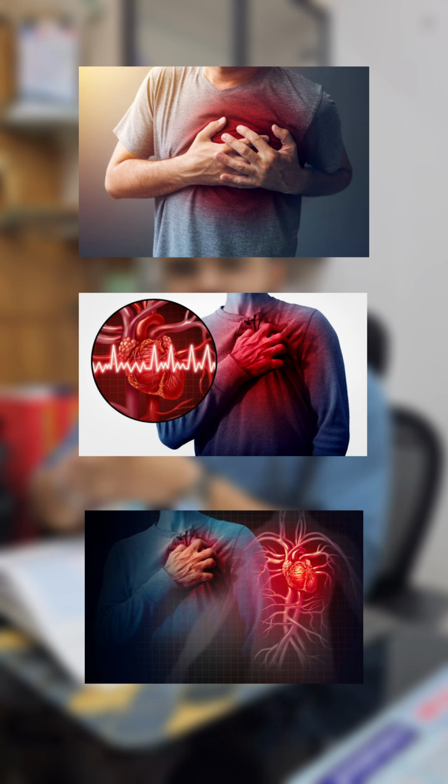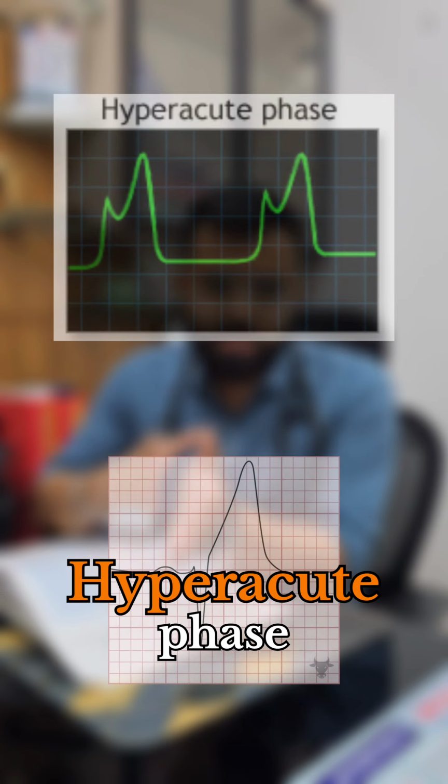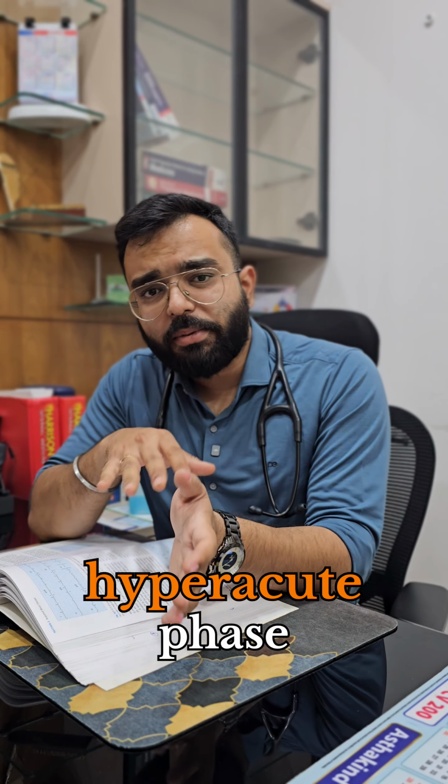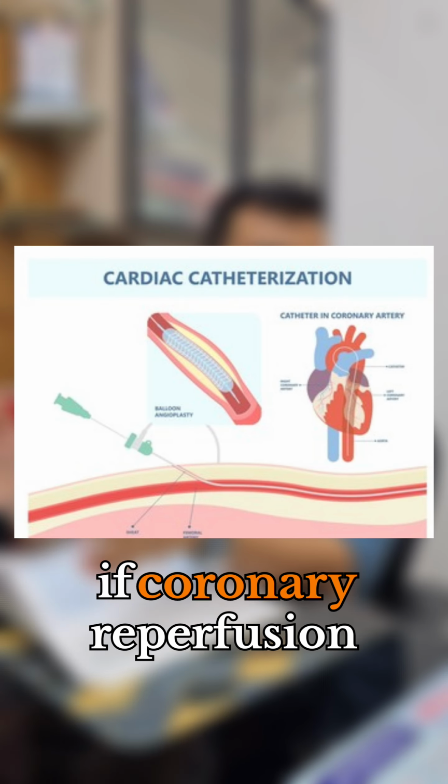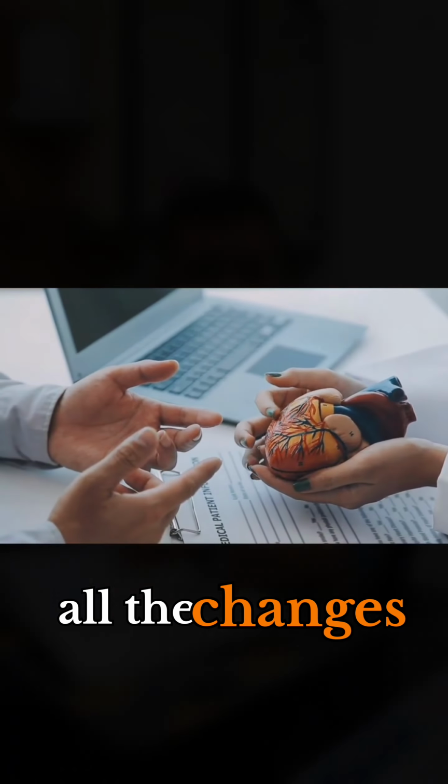So the changes of acute myocardial infarction on an ECG can be divided into three phases: the hyperacute phase, the evolved phase, and the chronic stabilized phase. The hyperacute phase refers to the time in which the ongoing injury is present, and it means that if coronary reperfusion is done in a timely manner, all the changes can be reversed.